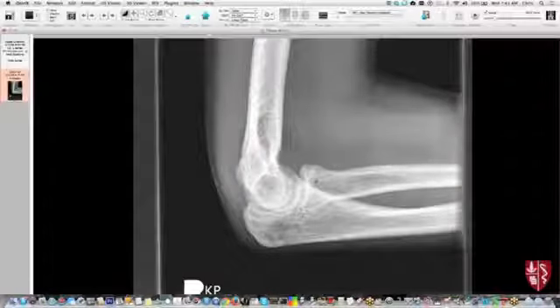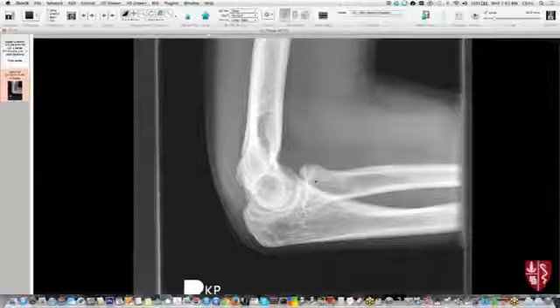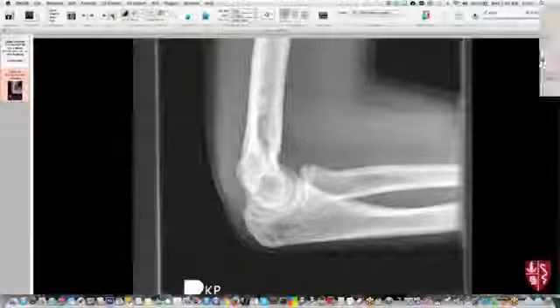So that's a radiographic sign that we should look for in arthritis. Having said that, different joints are better than others at showing effusion. So the elbow is a good joint to see effusions. We can see effusions to some extent in the ankle, not so much in the shoulder, not really in the adult hip. In the pediatric hip, we can see effusions and things like that. And in the hand and wrist, we can often see joint swelling that helps tell that there's probably an effusion. So simple things to start out here.